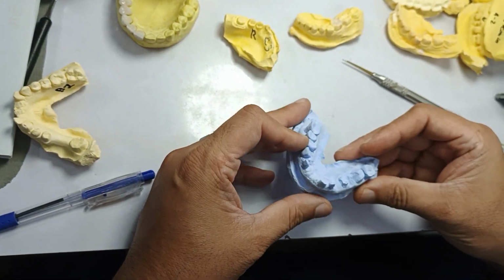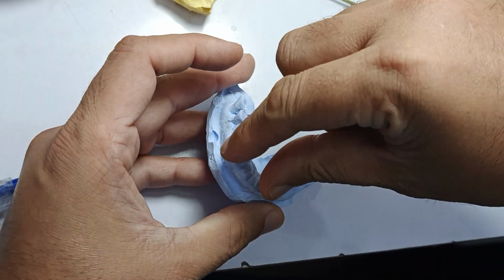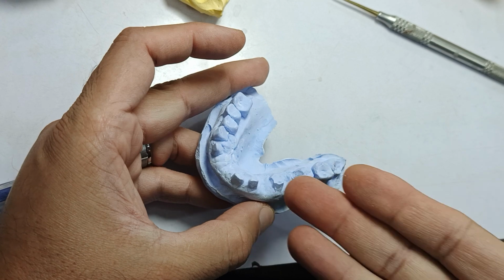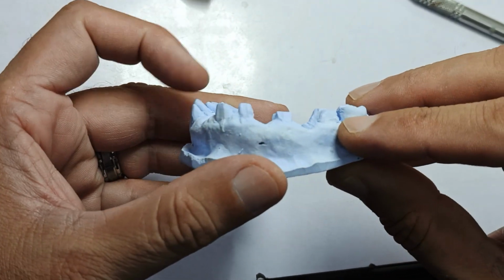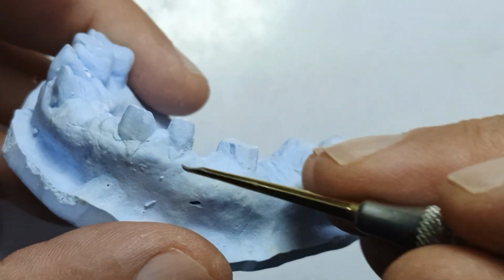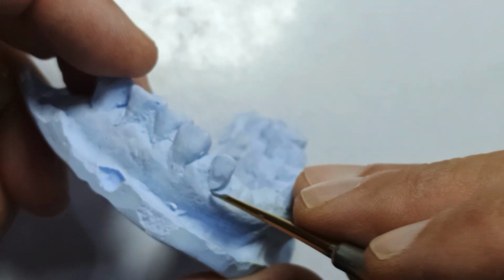Now look at this. Somebody sent this as an impression to do a full bridge. Even if you were to do this one bridge here, or combine, you should not combine two teeth. And look how they carved it in. And this is the margin they have. Get close up to it, please. What margin do we have? What is this? Look at that. And here, there's a bubble right on the margin itself. And right there. This is a horrible example.